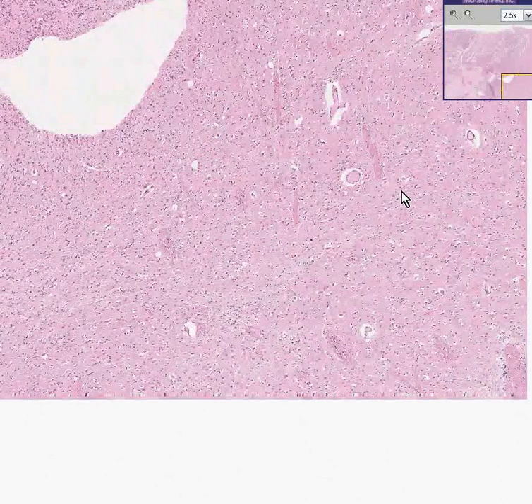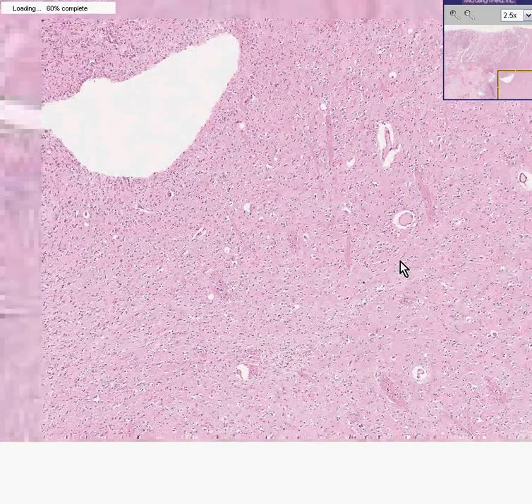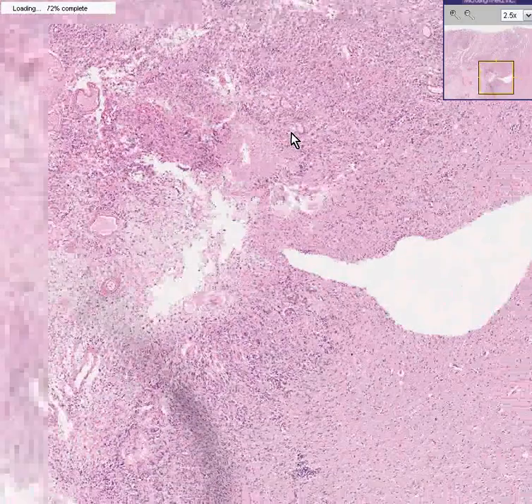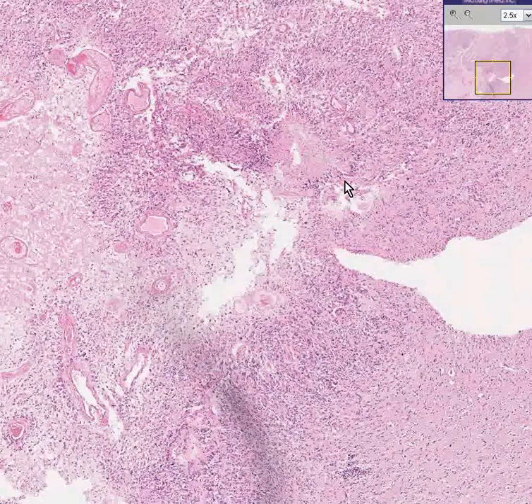But when you move over to the tumor area, you can see we no longer have differentiation between glial reaction and neurons. We now have a very, very ugly picture of something that has these abundantly prominent blood vessels.